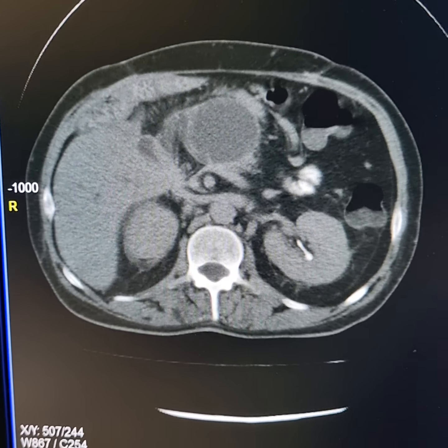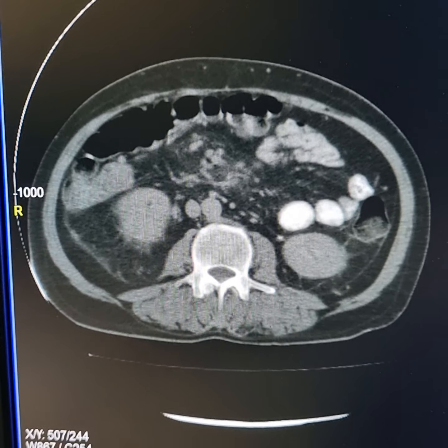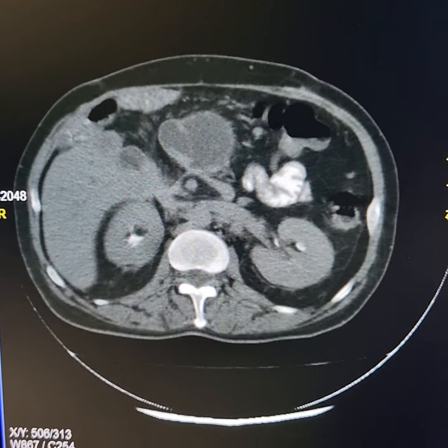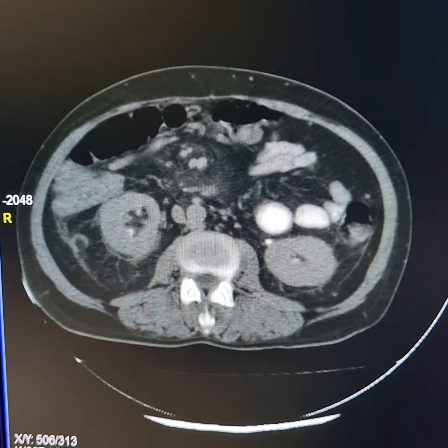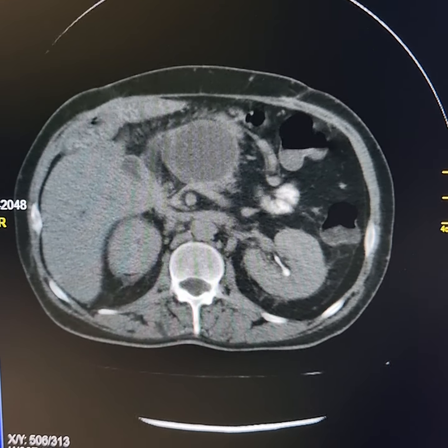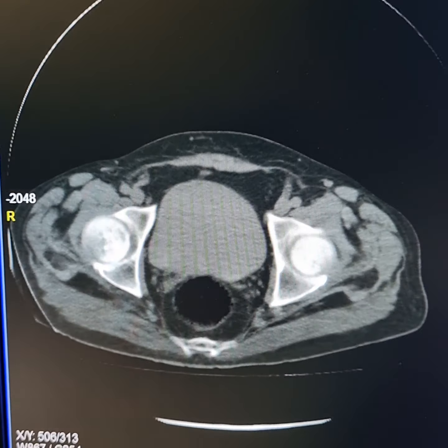Excretion of contrast medium is present, although delayed. There is no hydronephrosis. This is the left ureter. There is delay and poor excretion of contrast medium on the right side. It is because of the vascular encasement by the metastatic mass lying anterior to the mid-polar region of the right kidney. The rest of the abdomen is essentially normal.